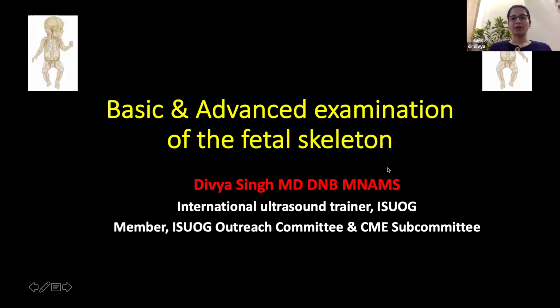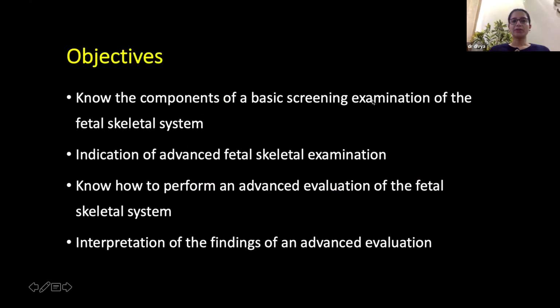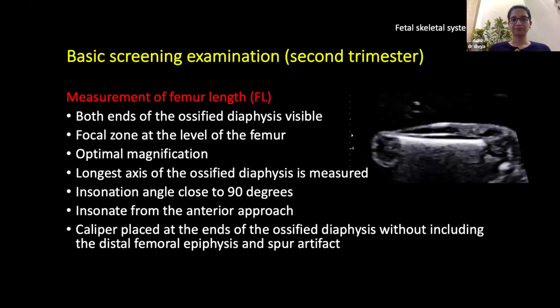Speaking on the basic and advanced examination of the fetal skeleton. The components of this presentation include how to perform a basic screening examination of the fetal skeletal system, the indication of advanced examination, how to perform an advanced examination of the fetal skeleton, and then interpretation of findings of this advanced examination.